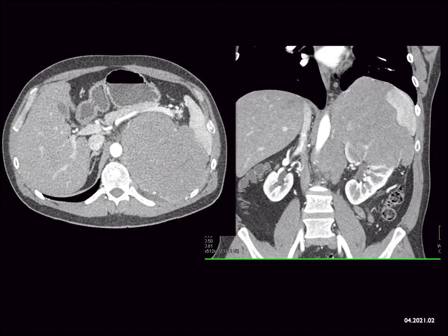With renal cell, you can get extensive tumor infiltration. It can involve the renal vein, the IVC, can extend around the kidney, but this is somewhat homogeneous. 85% of tumors of the kidney are clear cell, they're hypervascular. This would be a most unusual papillary. Transitional cell carcinomas are carcinomas of the calyces or the renal pelvis, so that's not going to be the case. An adult Wilms tumor is just so rare, I'm not going to think about that.